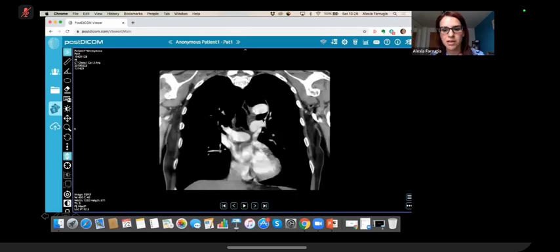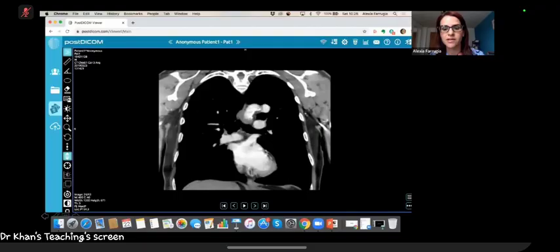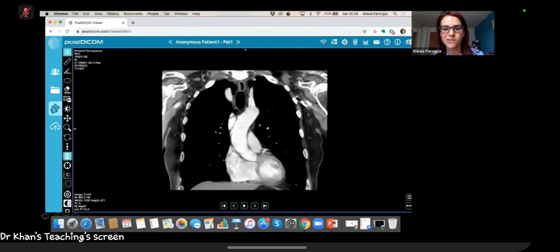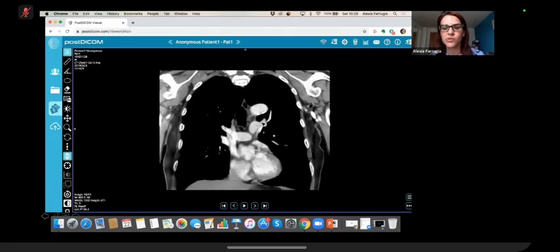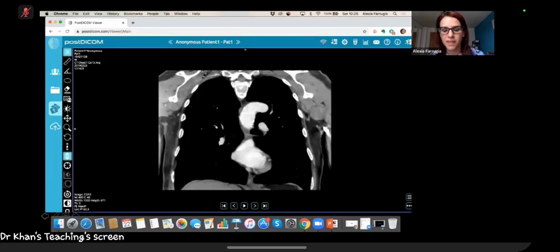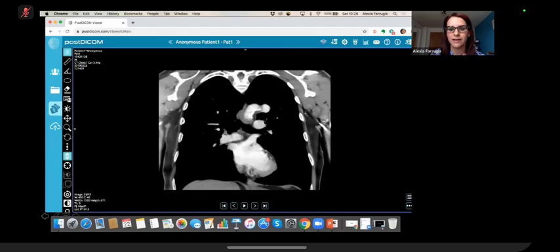Do you think it's a coarctation, or does it look like a coarctation to you, or really? It doesn't look like a typical coarctation. No. In fact, it is a pseudo-coarctation. Right. It's a congenital anomaly. The important finding is that there's no hemodynamically significant stenosis across this area of kinking or buckling.